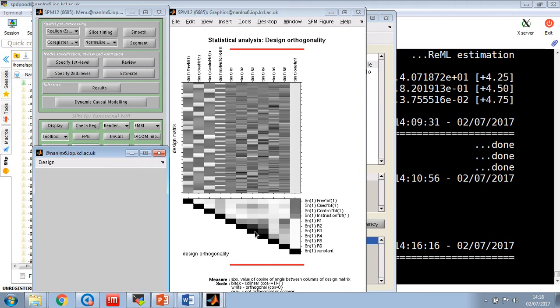Yeah, it is. So you can see here, this regressor here, if you look at these periods where there's a lot of motion, they marry up quite well with this. Actually, it seems to be this phase here that's the biggest problem. Okay, so that just gives you a little idea of whether the conditions are highly correlated or there's any problems.